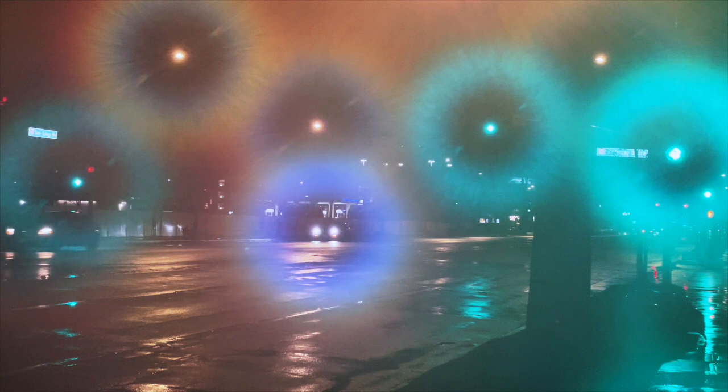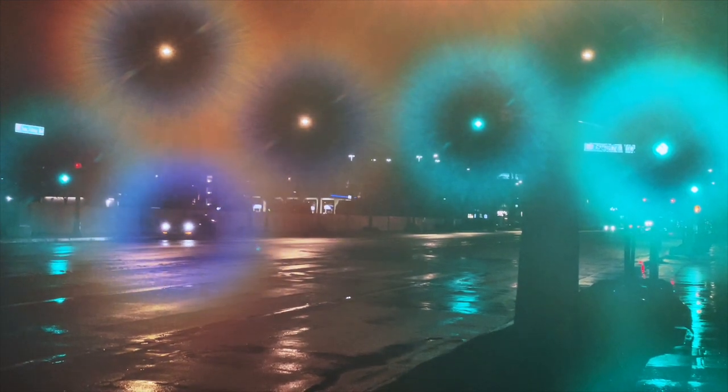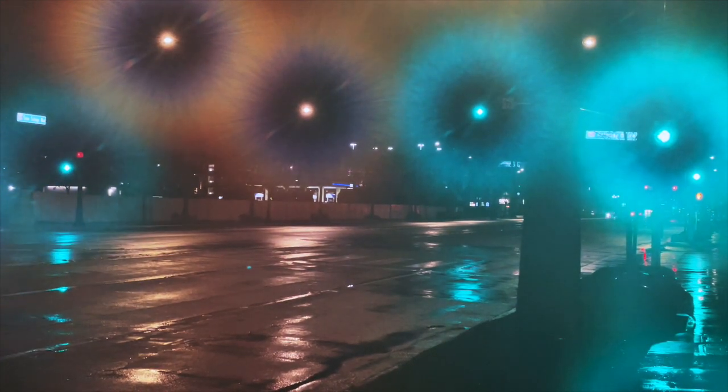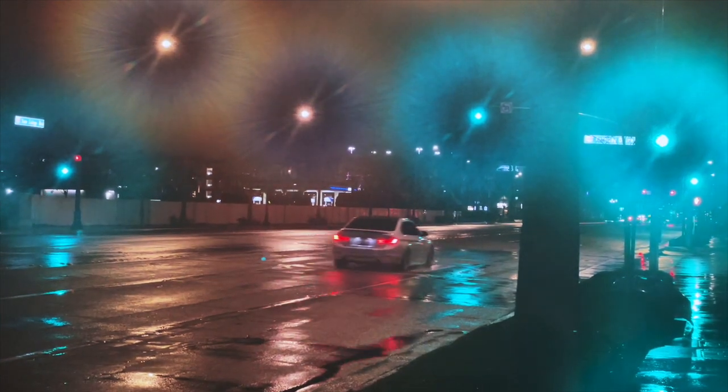This again is an example of what glare and halos look like at night. You are likely to experience this with this type of lens. It is possible for these to decrease over time as your brain grows accustomed to it. However, this lens should be avoided if you are sensitive to this type of glare.